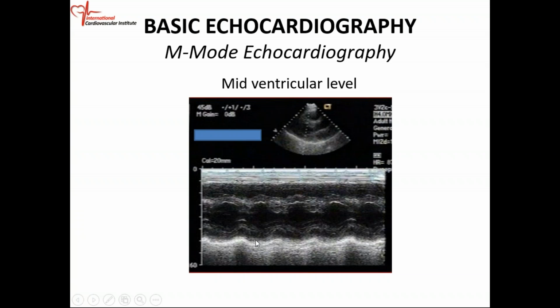So if you look down below where you have the M mode, on the vertical axis you have distance, and this is divided into what look like millimeters.